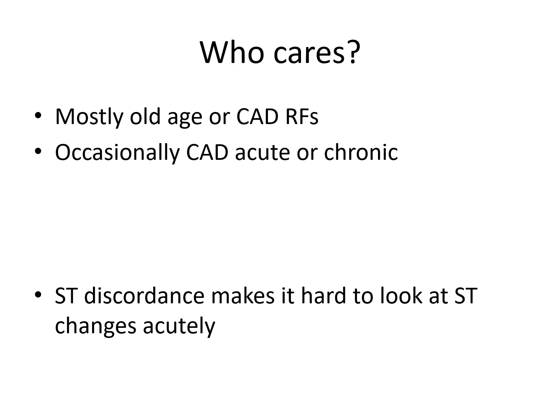That said, though, the discordance between the QRS and the ST makes it very hard to look at the ST changes acutely, because there is always presence of ST depressions in the upwards looking QRSs and ST elevations in the downwards looking QRSs. Luckily, we have developed a set of criteria that allow us to look at ischemic changes even in the presence of this discordance.